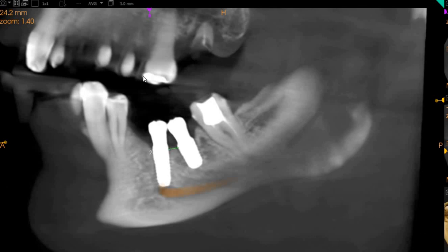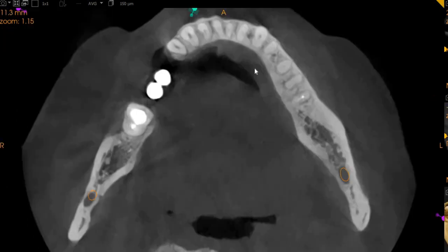2.8 millimeters. But the problem, however, is the restoration phase. So we will highly advise, because both the abutments are completely joined together, as can be seen here on the axial view as well. We will advise either customized abutments for this tooth.